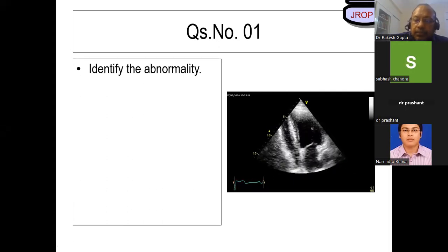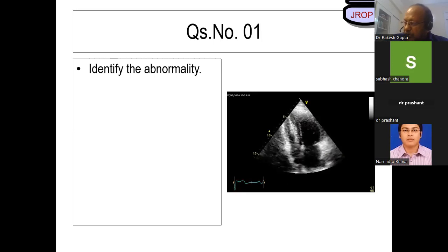This seems to be contracting fine. Now we have shifted gears from LV function, systolic, diastolic, to cardiomyopathies. So this is normal contractility.